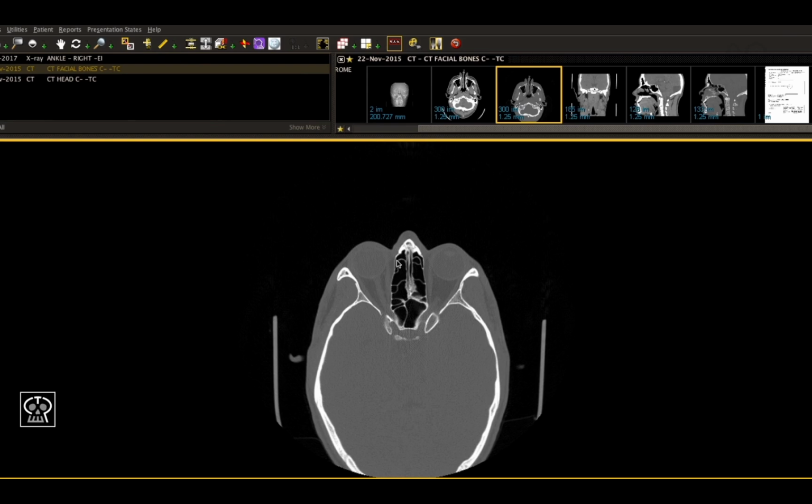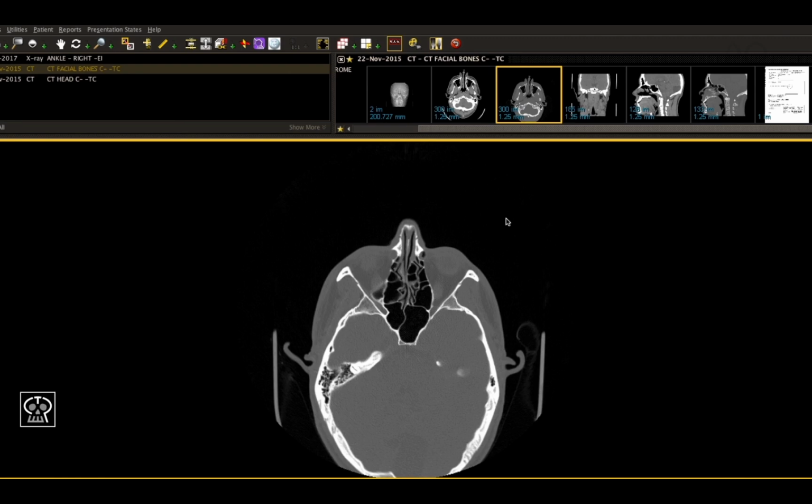Once again, I would like to emphasize that when analyzing a CT facial bone scan, you won't particularly be looking for an NOE fracture. Rather, while doing your analysis, you will note fractures of the nasal bone, the orbital region, the medial wall, the ethmoidal region, and this will lead you to realize that there's a pattern of fracture known as an NOE fracture that is present on your scan.